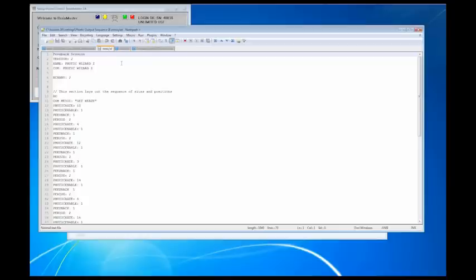The first one I do want to cover is this one called Photic Wizard 1. And the reason I really want to cover this is because a couple of you guys out there might have purchased from ISNR or might have interest in purchasing the MicroTesla rTMS system. Now, the way that that works currently is actually through the photic output of the Atlantis system, and coming soon is going to actually work through the audio output of the Atlantis system.